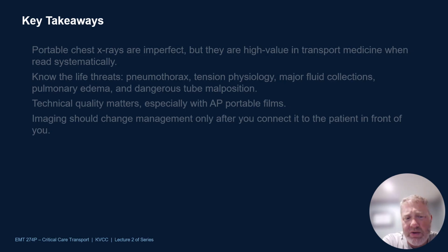The technical quality matters, especially with AP portable film, so don't use it as the be all end all. And imaging should only change your care of the patient after you connect it to the patient in front of you. Use it as a guide, as a key. Remember that black is air, white is consolidation and or fluid of some kind, and go from there.